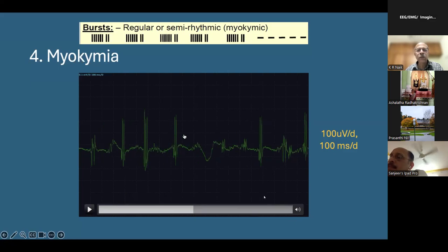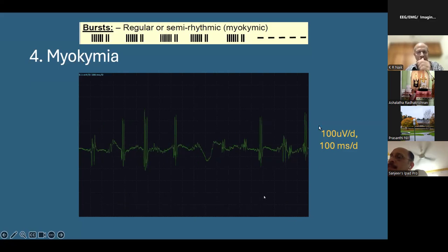Okay, here 1, 2, 3, and 4. Sometimes 4, sometimes 5. The tremor will not be so irregular. Almost always the tremor is going to be regular if it is a genuine tremor. Pseudo tremor or the hysterical tremor will be irregular, and the EMG bursts are going to be much longer, about 50 to 100 milliseconds.